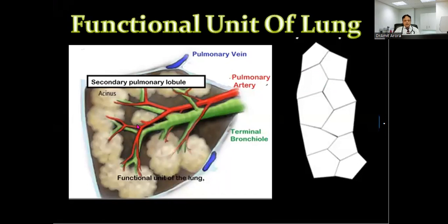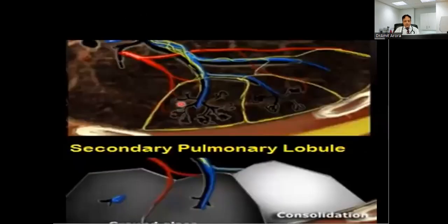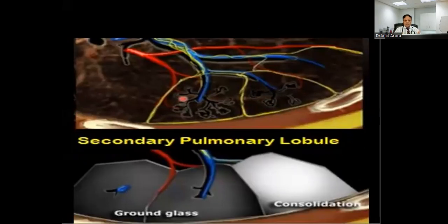So first, you need to understand this in HRCT, because suppose I have to demonstrate some pathology, let us differentiate between ground glass opacity and consolidation. I will tell you what ground glass opacity is, but right now just understand with this. In ground glass opacity, you can see across the opacity and appreciate the vessels. I will demonstrate, please wait. And in consolidation, you will not be able to.